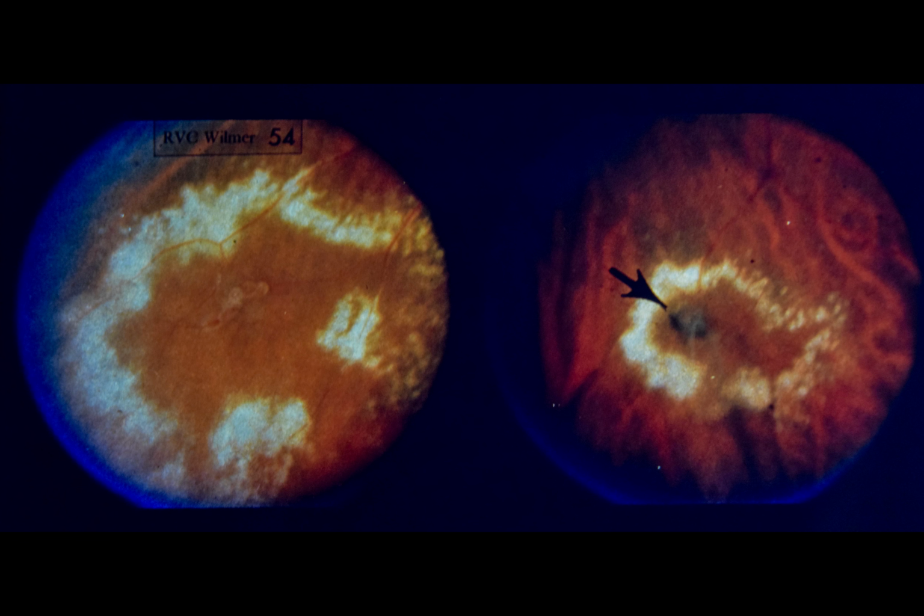If he develops a marked increase in lipid deposition, or should he become symptomatic as a result of macular involvement, photocoagulation treatment would be directed towards abnormal vascular lesions in the central portion of the lipid rings. It is interesting to follow these lesions with serial photographs.